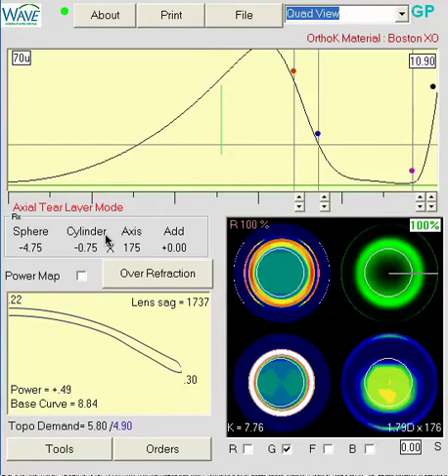So I don't think we would make a target of molding out all the corneal cylinder. Some of it would be fine, and if we can get rid of maybe half of that, and the patient had residual cylinder of half a diopter, quarter diopter, so should still be a very good visual outcome. The other thing I would recommend is, I think this is a child. I'm looking at the topographies. The apertures are really small. I'm guessing this is a child.